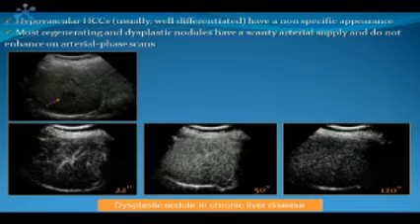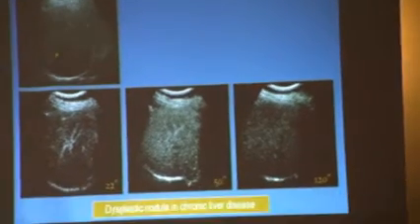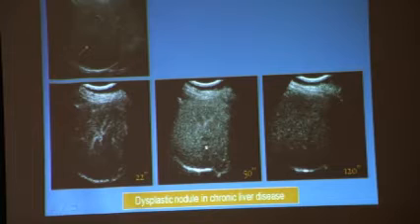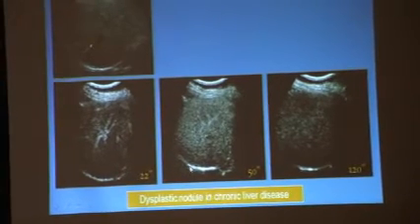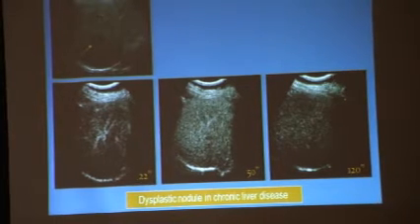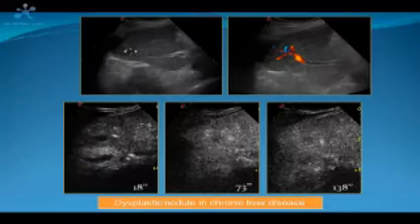But also hypovascular HCC do exist, and this is a problem for differential diagnosis, but also for the other imaging modalities, as well as premalignant lesions, which can be somehow characterized. If we do not see any enhancement in the arterial phase, we usually describe this kind of lesion as dysplastic nodule, and in our practice we do a short-term follow-up with CEUS at 3 months in this kind of lesion. Mostly depending on the size of the lesion, of course.